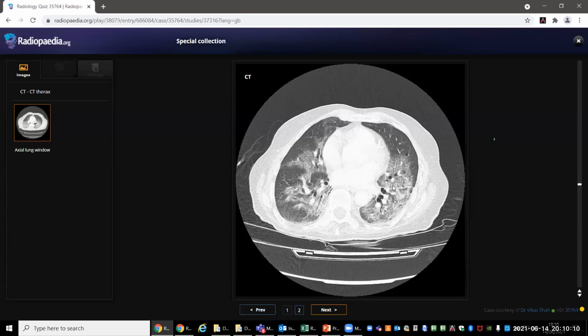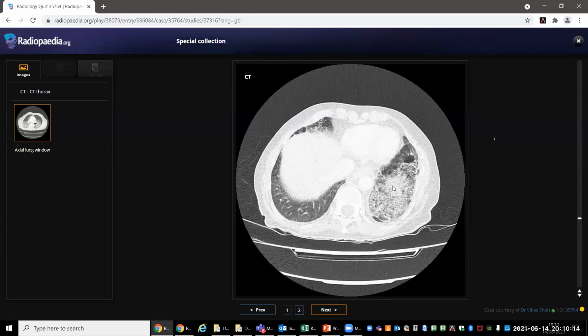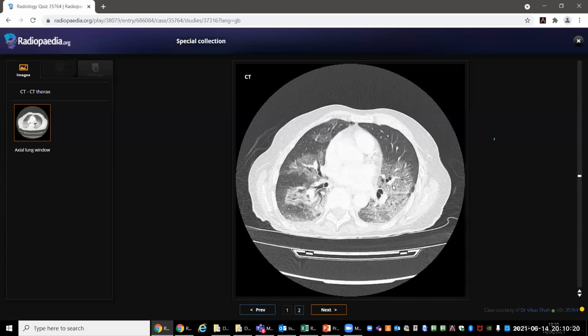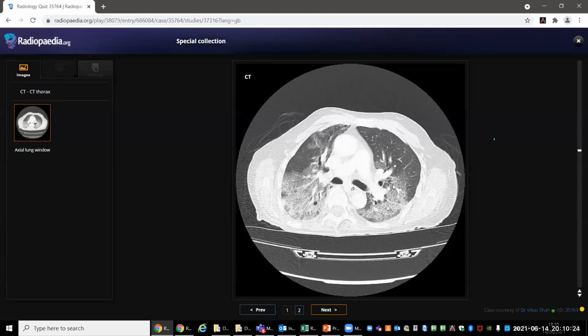So okay. I want to show you something. Just hold on. What is this? Okay, small lung cyst. Does that help you in any way? I'm not sure. Okay, maybe I'll be thinking about the differentials of cystic lung diseases also. So in the presence of diffuse lung involvement and lung cysts, lymphoid interstitial pneumonia. Okay, let's move on.